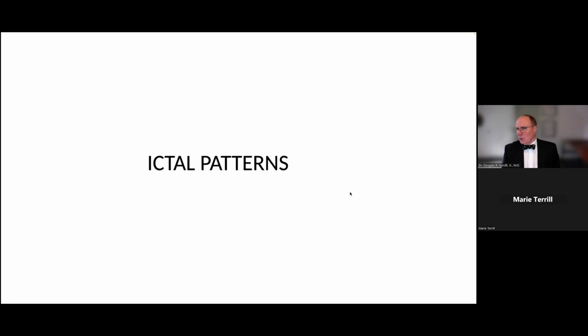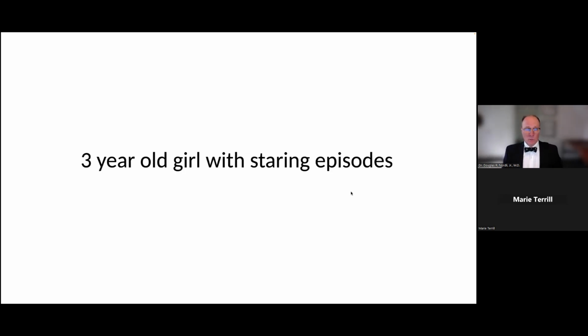Okay, so ictal patterns. Now, the good news is for focal seizures in kids, the ictal patterns are very, very similar. Not neonates, we'll talk about that in a sec. But once you get into infancy and beyond, focal seizures look very much like focal seizures in the rest of the lifespan. So let's take, for example, this 3-year-old girl who's having behavioral arrest episodes recognized as staring episodes.